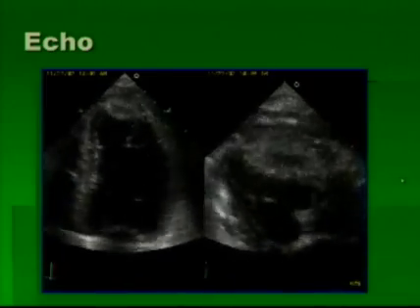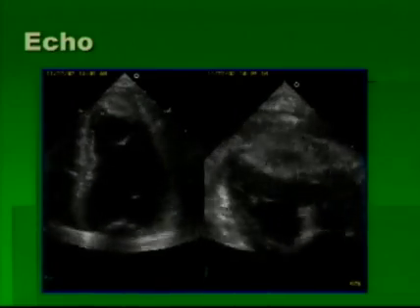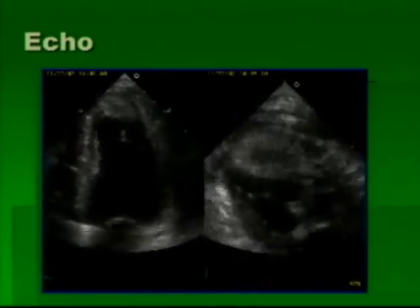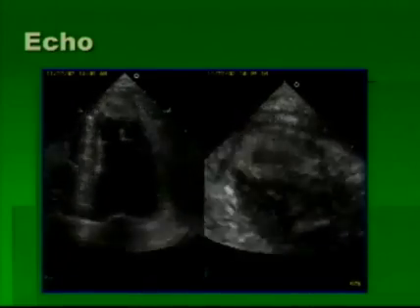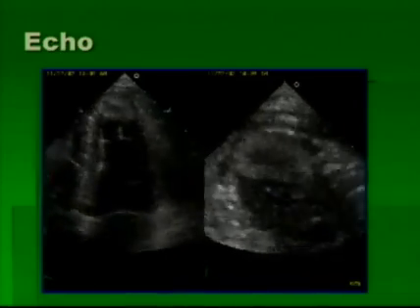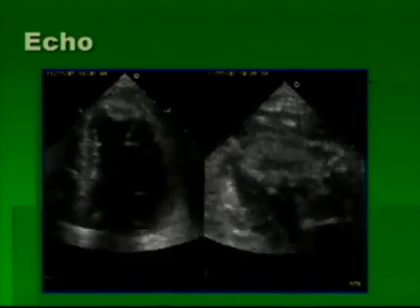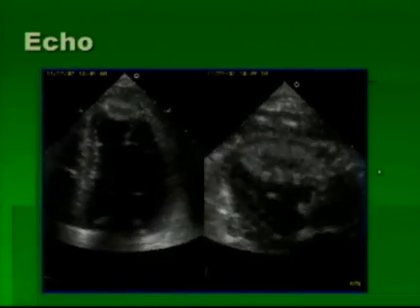This is an echocardiogram which was recorded from a 19-year-old patient who presented with fever and chills, sweating, and fatigue. Later in the program, we'll actually reveal what this unknown is. But for now, I want to go over an outline of what we're going to talk about.